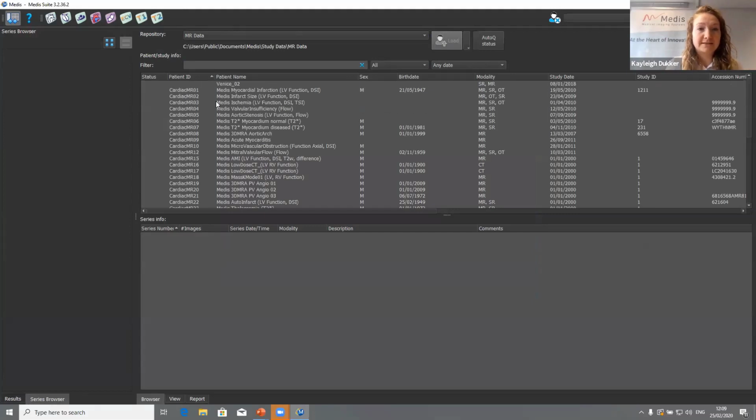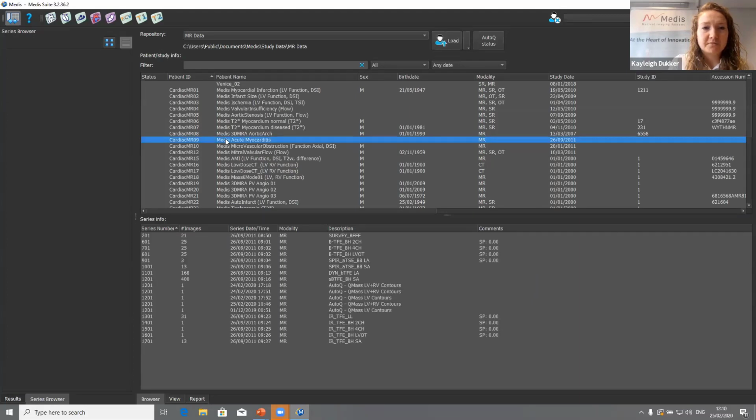So then the next topic, the left ventricle and right ventricle contour detection. As you hopefully know, and otherwise please contact your salesperson, because I do think it's a really interesting feature, with our last release we also released a method where we can automatically detect the short axis series that comes in.